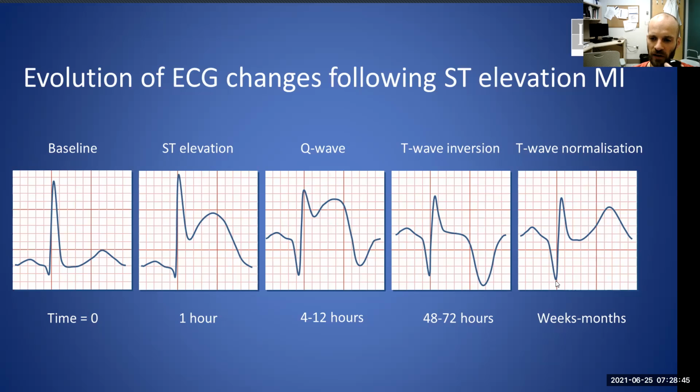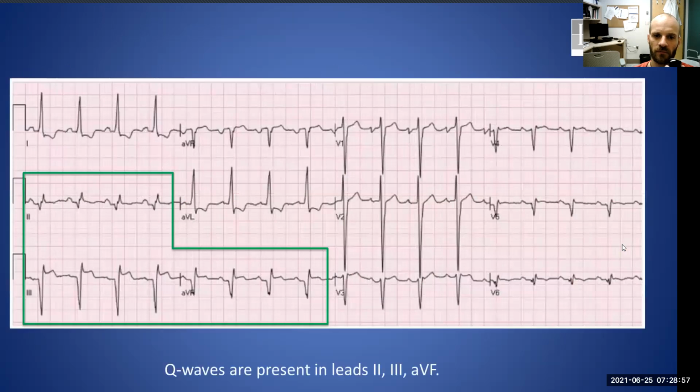Myocardial infarction isn't the only thing that can cause abnormal deep Q waves, but they are definitely abnormal and they're something to pay attention to. Okay? And one of the things that can cause that is a previous myocardial infarction. So, for example, in this ECG, rather than being in the acute phase of a myocardial infarction, this is someone who had an MI quite some time ago.